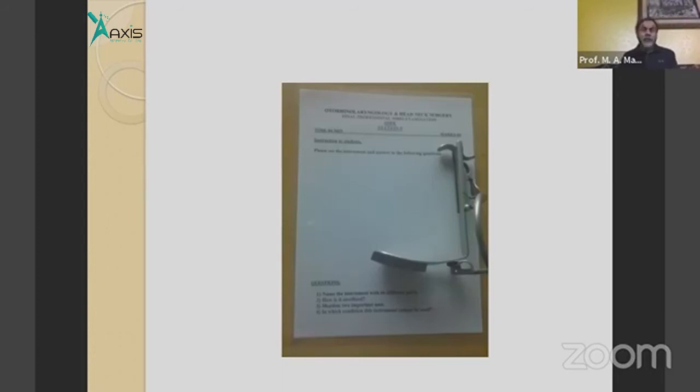Number 3, operation in the palate, soft palate, or oropharynx, like repair of cleft palate. We can use this one for removal of any cyst from the hard palate, like a palatal cyst, or removal of any tumor from the palate, like pleomorphic adenoma, or any other things in the palate.